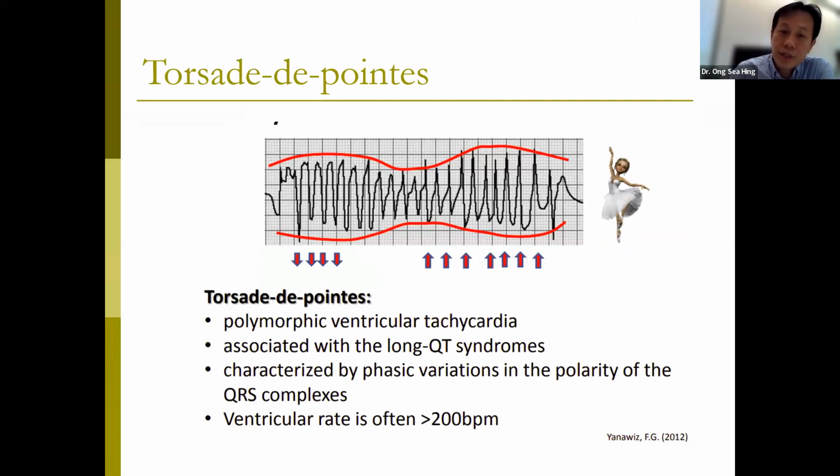Obviously, if you remember some of the principles that we talked about for ECG reading, we need to know the axis, we need to know which direction electricity is going through, as well as being able to recognize right bundle from left bundle. These are very basic things, but they can help us a lot to understand certain ECG findings that we will go through. So the rest of the slides today will be some cases, and then I'm just going to briefly mention some points about certain diseases that we may encounter when we look at ECG.